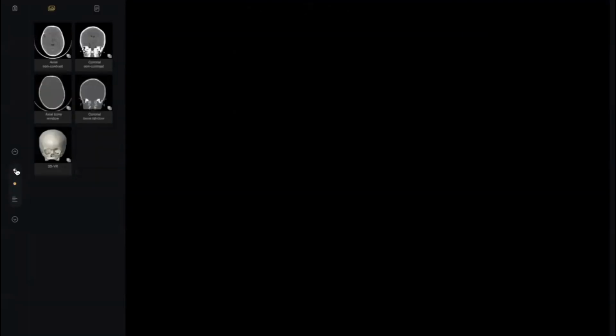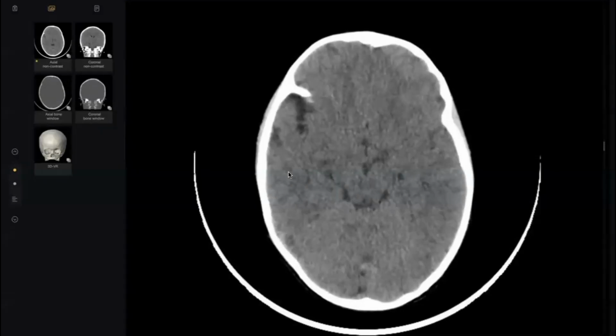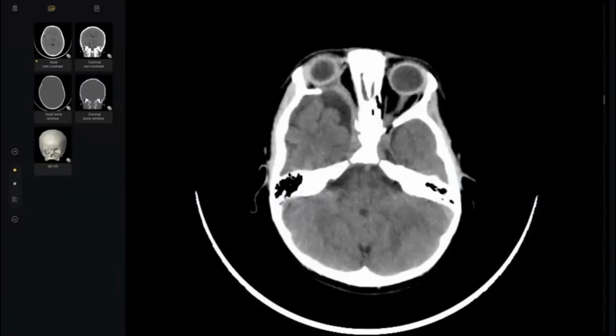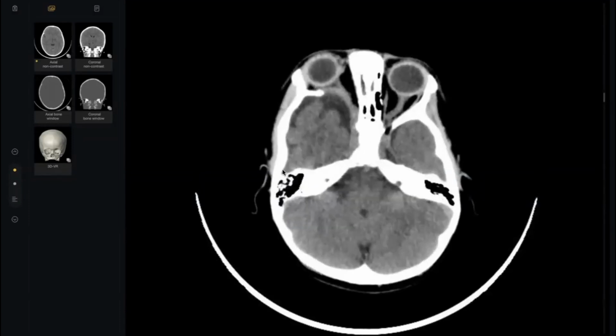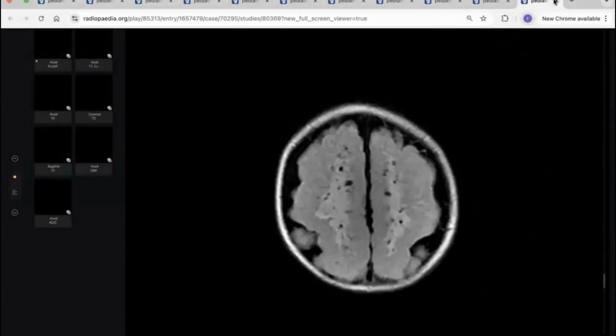See, the case starts from here, my colleague. If we didn't pick up this one, in the viva, in the real exam, the examiner will not give you a window. If you pick up this dysplasia, he will then give you the MRI and you will pass the case. But if you didn't pick up this one, you fail the case. Okay, my colleague, thank you so much. Next candidate.